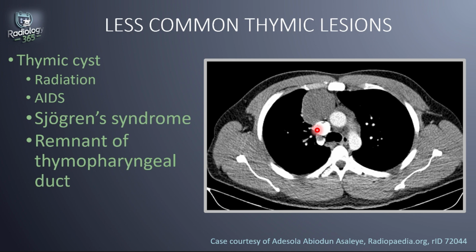the prevascular mediastinum. CT scans will show a simple fluid attenuation cyst in the prevascular mediastinum, typically centrally located. It may measure greater than simple fluid in attenuation if it contains proteinaceous or hemorrhagic contents. The cystic nature can then be confirmed with an MRI. So in this image, we see a well-defined hypodense non-enhancing mass. The Hounsfield unit measured 24, which is a little high for simple fluid, so this is likely to be containing some proteinaceous content. So this was a thymic cyst.